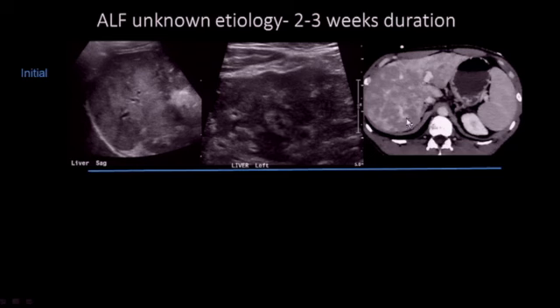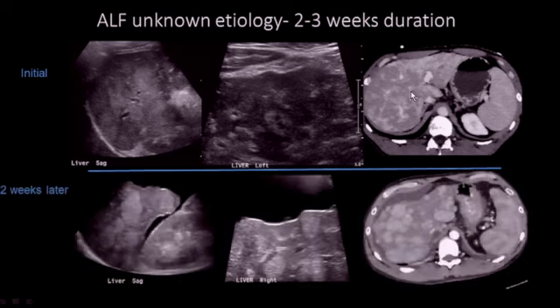The patient had a contrast CT, and you can see there are large, ill-defined areas, somewhat confluent, that are hypodense, and other areas slightly more hyperdense. 2 weeks later, the patient was still with us, and more imaging was done with both ultrasound and CT, and this shows exactly what can happen very, very rapidly. Remember again, these areas are probably the normal areas of liver, slightly ill-defined.